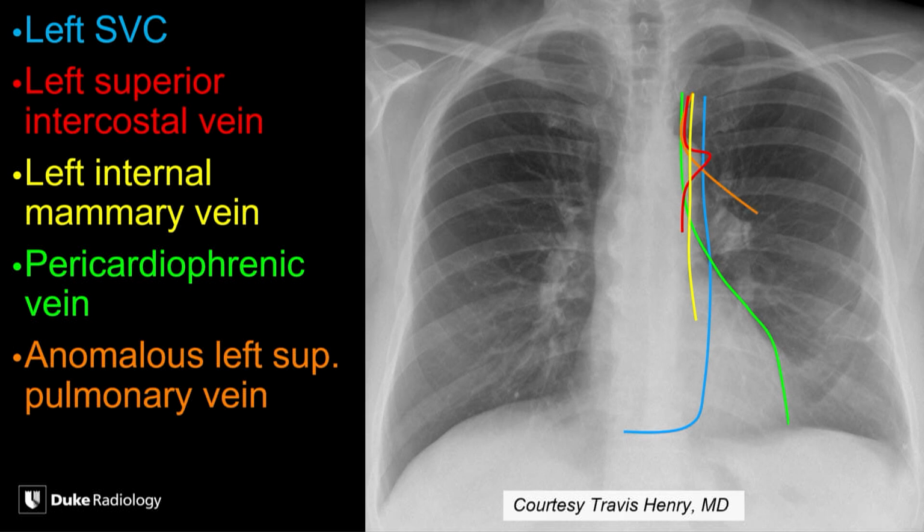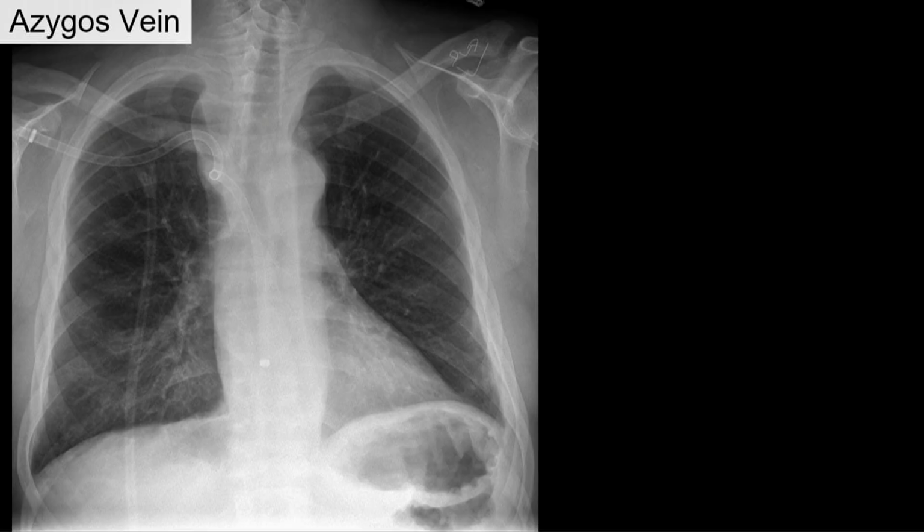All right, and then occasionally you will have anomalous pulmonary venous return, both left upper or right upper lobe, where the catheter could take a really bizarre appearance like this. And on the right side, not infrequently, we will see positioning into the azygos, and those sorts of catheters will take sort of this dipsy doodle along in the region of the azygos arch and then come back into the paraspinal region. So I'll look at a couple of these.